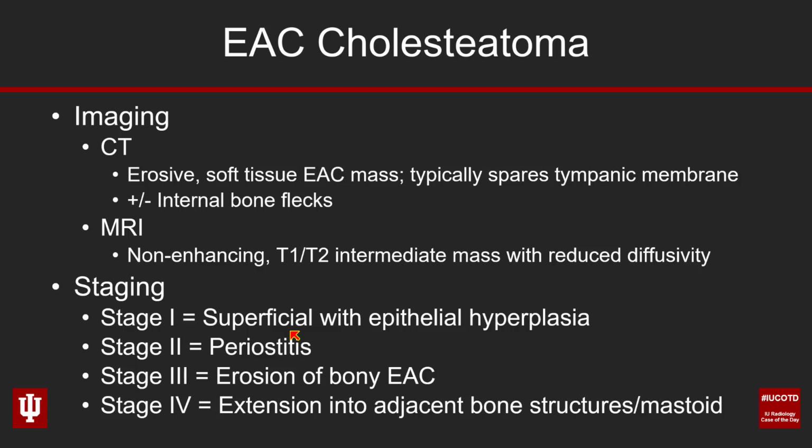Obviously, you want to talk about bone erosions, but especially if this is becoming transosseous, as this one was, getting into the mastoid middle ear, that's clearly something you want to report because those patients are much more likely to need a true formal surgical excision rather than in-office debridement.